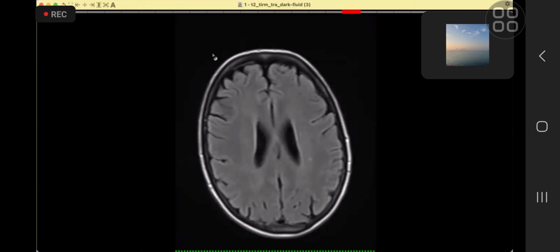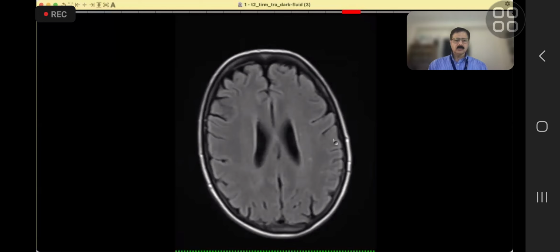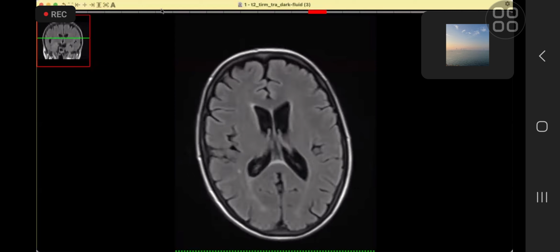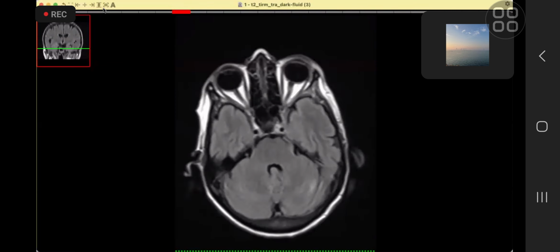Okay, doctor, I request remote control. Approved. I'm presented by MRI examination, FLAIR sequence of the head. I'll try to scroll first, then I'll start commenting in the exam.